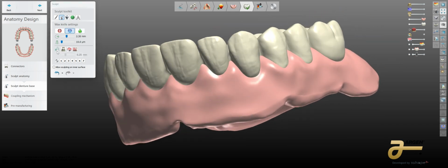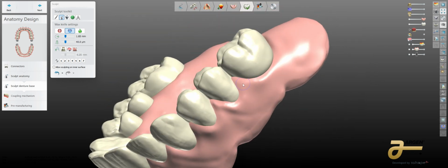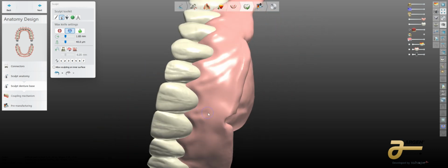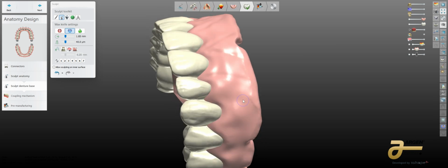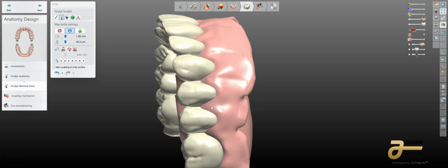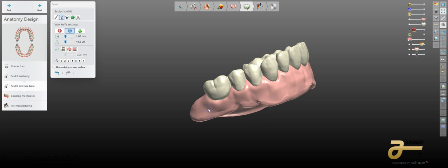So again, what I do on these cases, just like I was going to carve it with a Hollenback or half spoon, really quickly, I'm going to follow those contours. Not spending too much time, still not damaging the papilla. Just trying to make a little bit more contour to it.